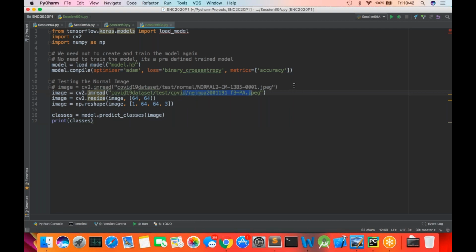I hope you have achieved a sense of satisfaction that we have done this image classification problem statement. Now it's basically a saved model. You are not training the model, you are just loading the model, applying the compilation technique, and using it. Now, what is the homework I want to share with all of you?